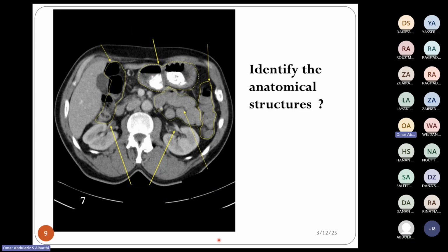Stomach. Okay. What is this here? Hepatic flexure, right? What is it? Colon of the area. Jejunum. Small bowel. Okay. And this one here next to it? The left colic flexure. Yes. Descending colon. Okay. I know you have the slides now, but these are the renal pelvis. Okay.